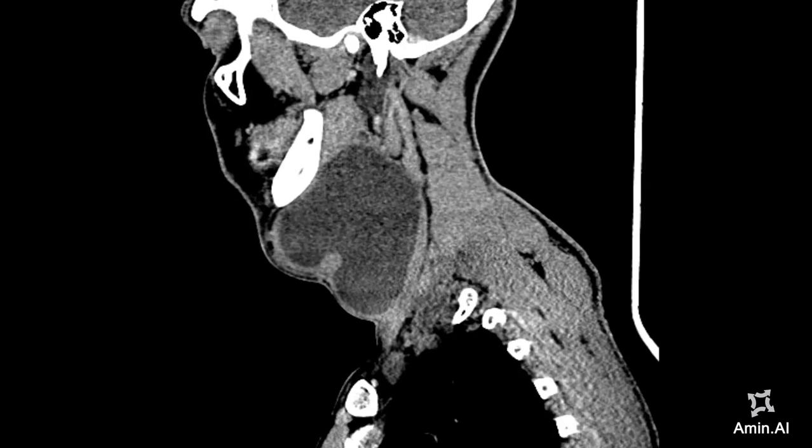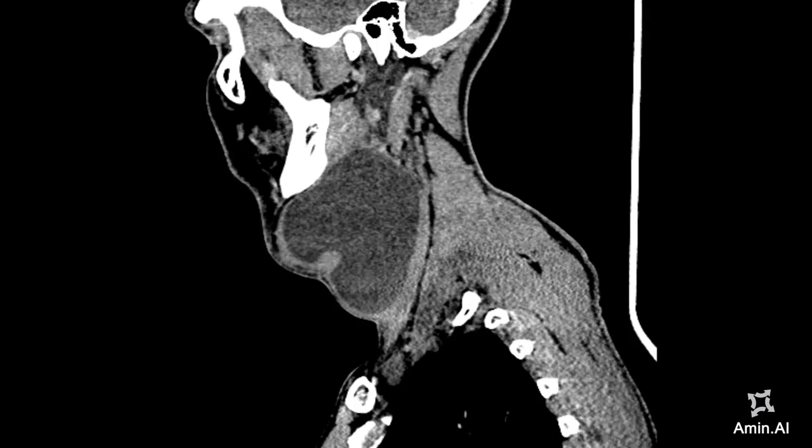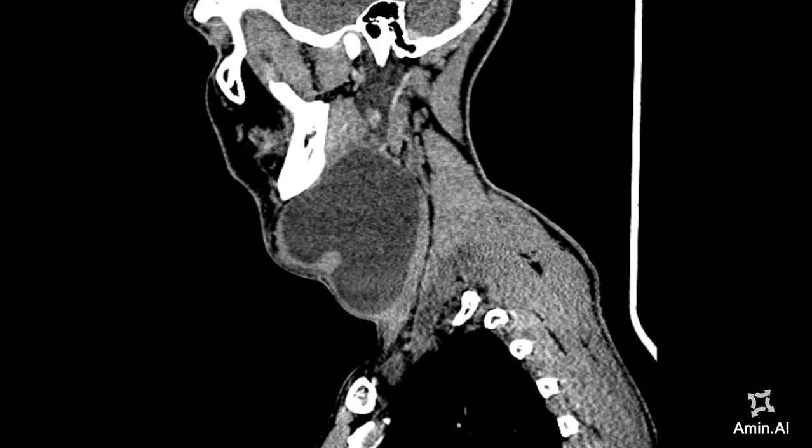A cystic area which is extending from the sublingual space into the submandibular space and is expanding with no aggressive feature is most likely suggestive of a plunging ranula. These are basically retention cysts which arise probably from sublingual or minor salivary gland regions, and they normally present with a mass in the floor of the mouth.